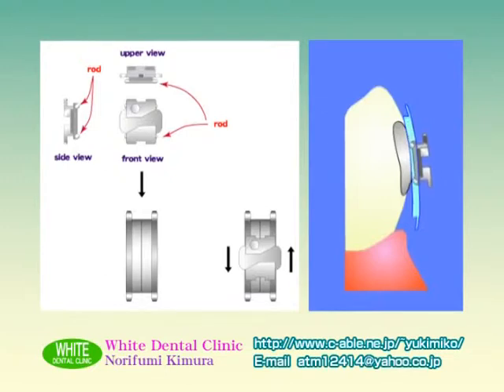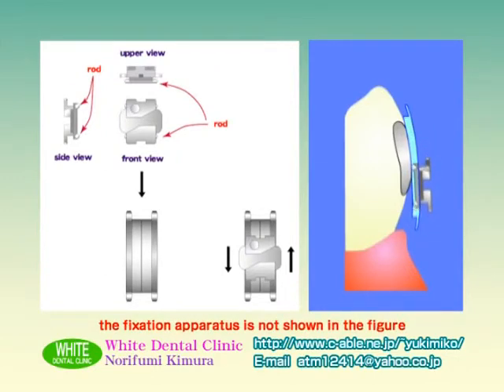This allows intrusion, extrusion, upright, and mesial or distal movements of the premolar as angulation is provided to the bracket. The premolar can be intruded or extruded by itself without replacement of the bracket and wire, which facilitates occlusal adjustment. A fixation apparatus for fixing a bracket, provided at the center of the sliding plate, allows usual use of the bracket with a jig or a gauge. The functions previously mentioned can be fulfilled by detaching the fixation apparatus as needed.